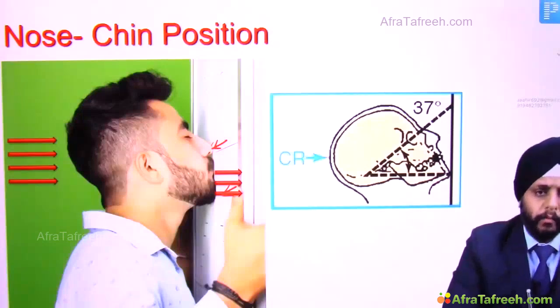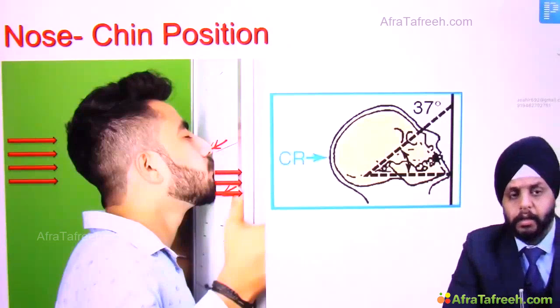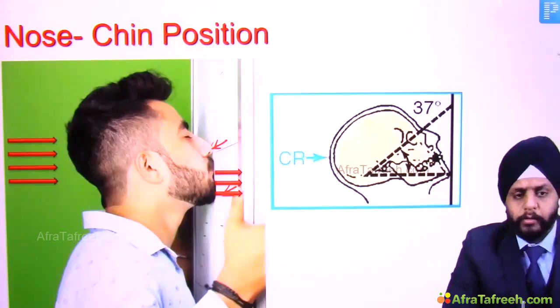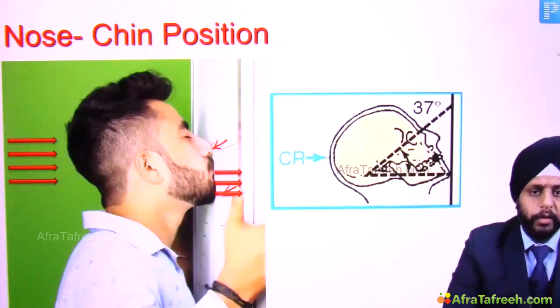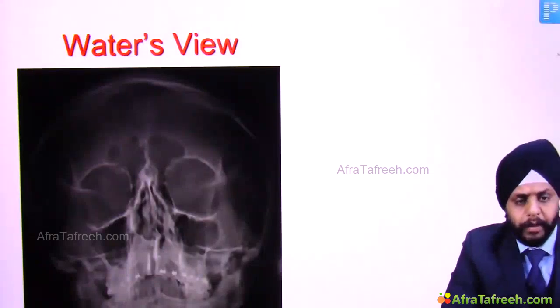So this view is also known as the occipito-mental view. Okay, so we have the Waters view. This is known as the nose-chin position, or also known as the occipito-mental view. Right? So let's come to this X-ray, the Waters view X-ray.